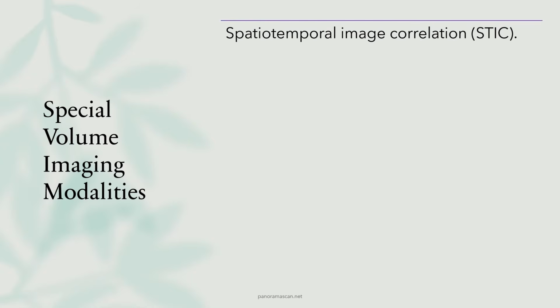STIC is a dynamic imaging technique that correlates 2D images over time to create a 3D reconstruction. This is particularly valuable in observing complex fetal movements and analyzing the fetal heart and circulatory system in motion. It helps produce time-synchronized images, allowing for a clearer understanding of dynamic anatomical features.